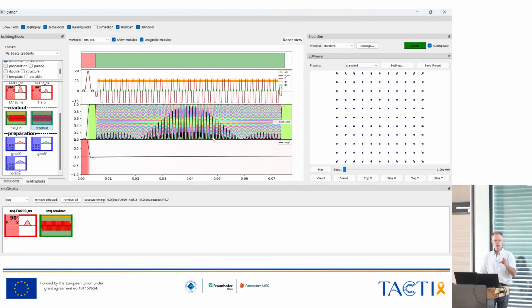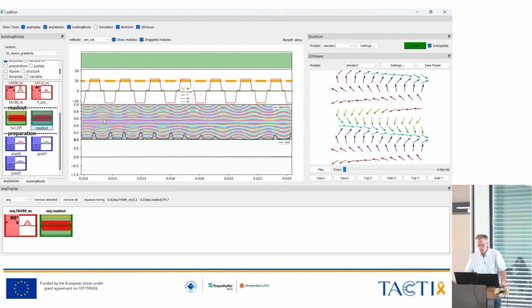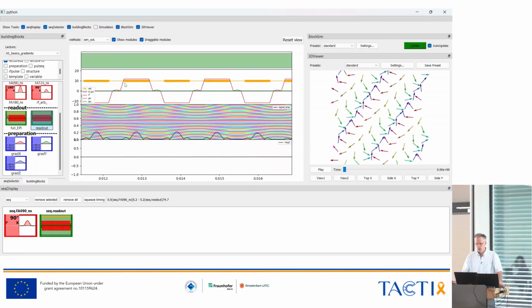I don't want to dig into the imaging part at this point, but rather assume we do have a readout. We are able to read out images, and they are actually switching gradients as well. And if you want to zoom in, the readout we are using here is a so-called EPI readout, which is just reading K-space in a zigzag pattern. You might be able to appreciate how this zigzag pattern looks by looking at the gradient pulses here.